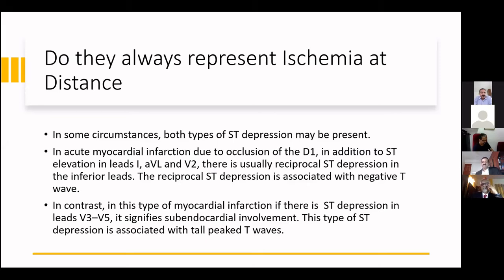But many a times, especially in an acute coronary syndrome, we have gone in, done an angiogram. We want to treat a lesion that is causing the patient's symptom and the patient's instability. We wouldn't decide on the angiogram. We get back to the ECG and have a look at the ECG thoroughly and then decide which is the vessel I need to tackle, especially when it is not a straightforward, simple, single vessel disease.